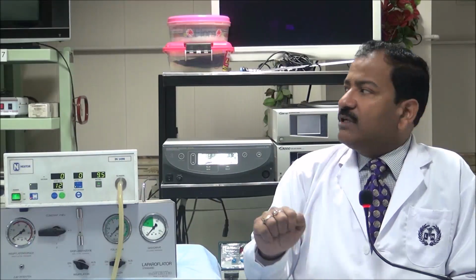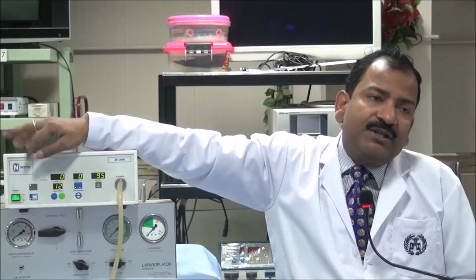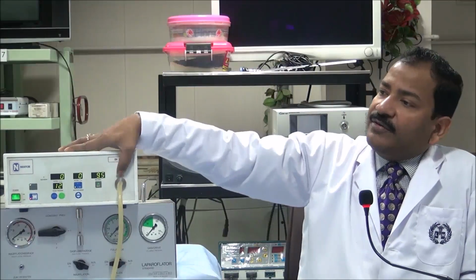Like if you will do the surgery for a baby, you need only 1.5 liters of gas. But if you will do a surgery of a 70-year-old grand multipara female, then she may take 6 liters, because after multiple deliveries, the abdominal wall is lax. In those situations, with a big size, it will take more gas. So this is very important to judge the total amount of gas.